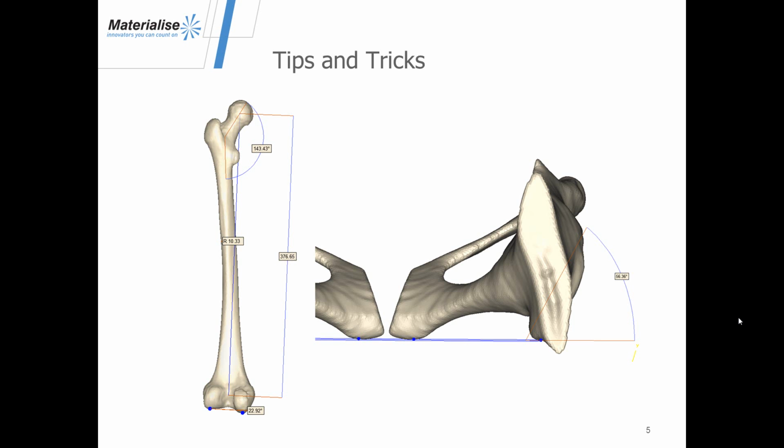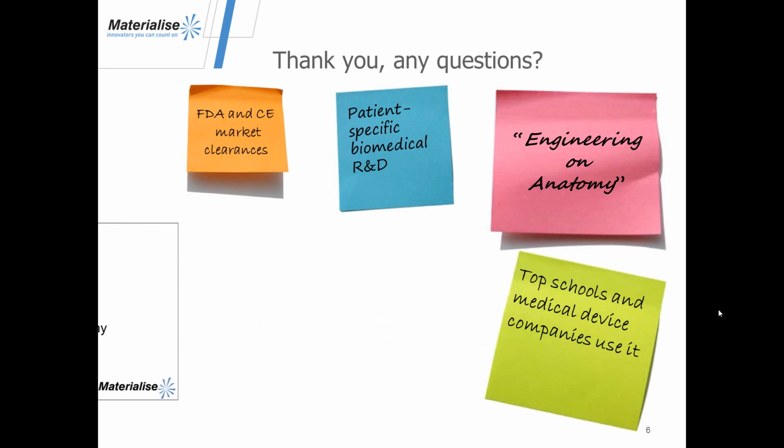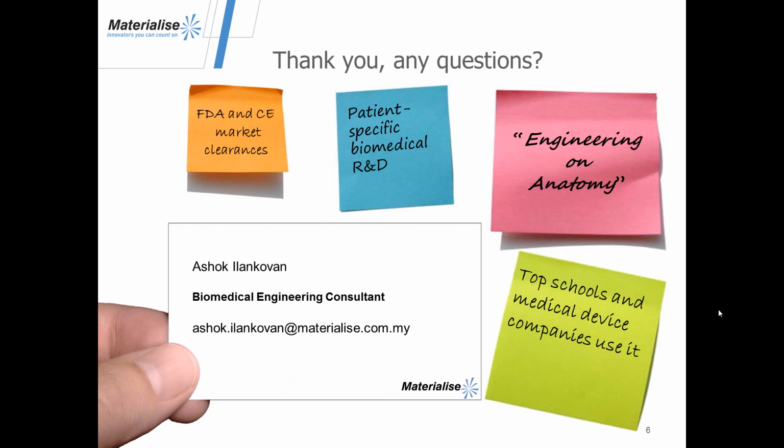Then for the pelvis, I'm going to show you how to measure the inclination angle of the acetabulum relative to the anterior pelvic plane. Now keep in mind that these measurements shown are only a sample of the measurements possible, so if you have certain measurements that you are interested to perform, we urge you to reach out to us and discuss potential workflows within the software.